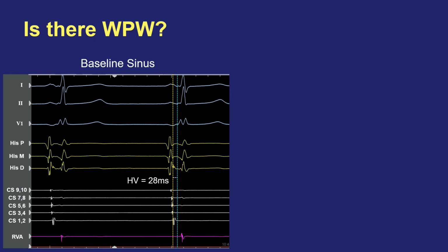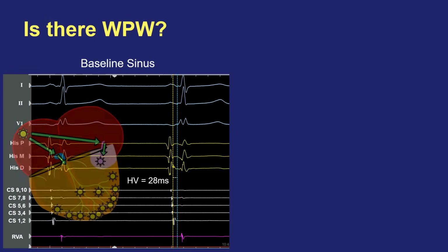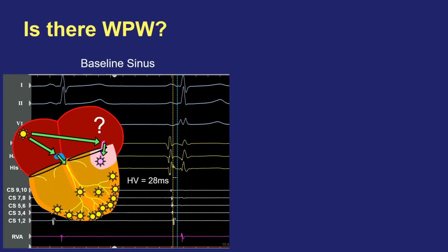And the first question you may ask yourself is, am I accurately even measuring to the beginning of the QRS? Is this a second part of the P wave? No, it looks like the beginning of the QRS here. Or am I just simply making a slightly abnormal or inaccurate measurement if it's only slightly short? And so really what you're asking here is, am I pre-exciting the ventricle in this case?